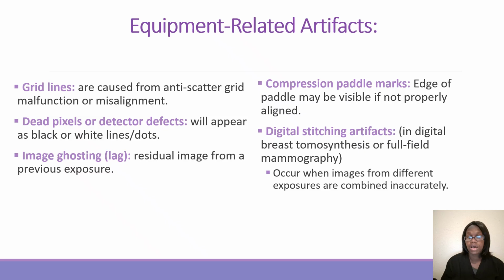I don't recall seeing a digital stitching artifact, but I'm sure I may or may not see it at some point in my career. Just let me know if you noticed this before.